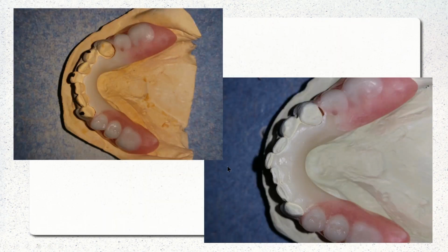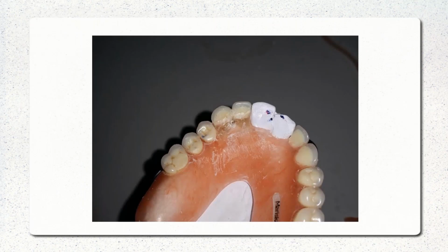So that's what I was kind of saying. It's probably even a little bit more repairable than metal. Sometimes, let's say your burr goes a little crazy and puts a notch into your frame, or you're finishing it, cutting it out, and you accidentally whack into the frame and put a dimple in it or scar it in some way.